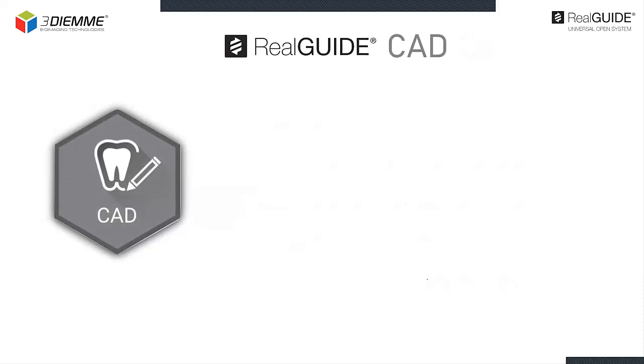The new CAD prosthetic design module, aimed at dental technicians, is also available as a standalone module and allows you to design the following customized prosthetic solutions.